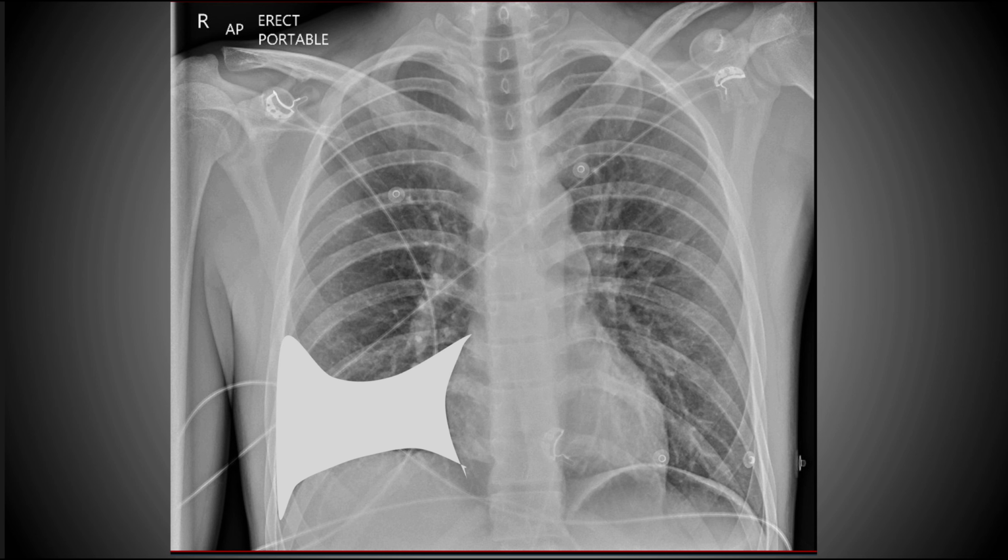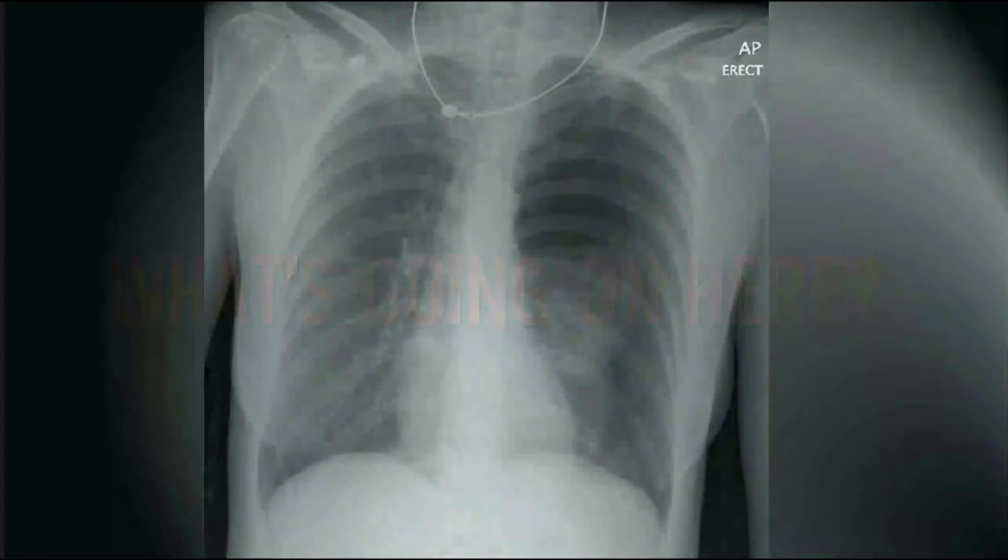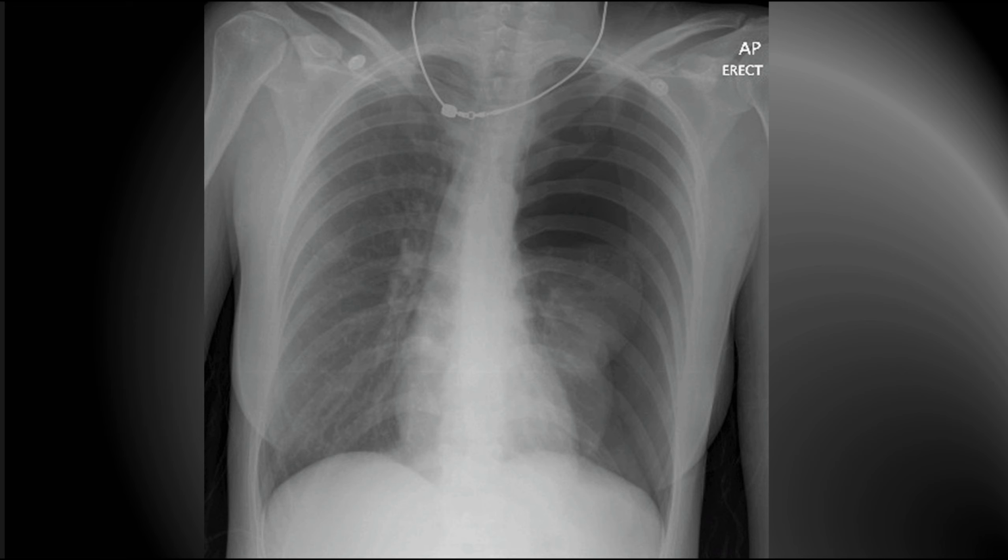If blood or fluid collects in the pleural space, it drains to the posterior dorsal part of the chest, and it appears radio-opaque or white, often with a meniscus. This is a pleural effusion or hydrothorax. Occasionally the liquid is blood, and we call that a hemothorax. Now let's look at a few examples. What's going on here? Take a moment and have a look at the picture.